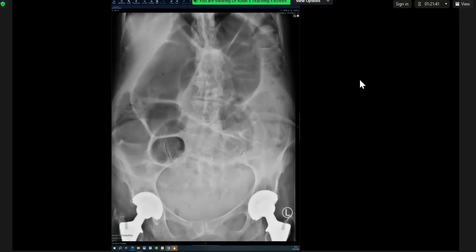Yes. You said you wanted to do a CT? Yes, contrast enhanced CT. To look for? To assess the cause of the intestinal obstruction. Why do you think there's an intestinal obstruction? I can see that there is dilatation of the bowel. There may be obstruction. I can see that there is interruption of the air within the distal colon. So this may be due to bowel dilatation, and I would like to evaluate the cause of this dilatation.